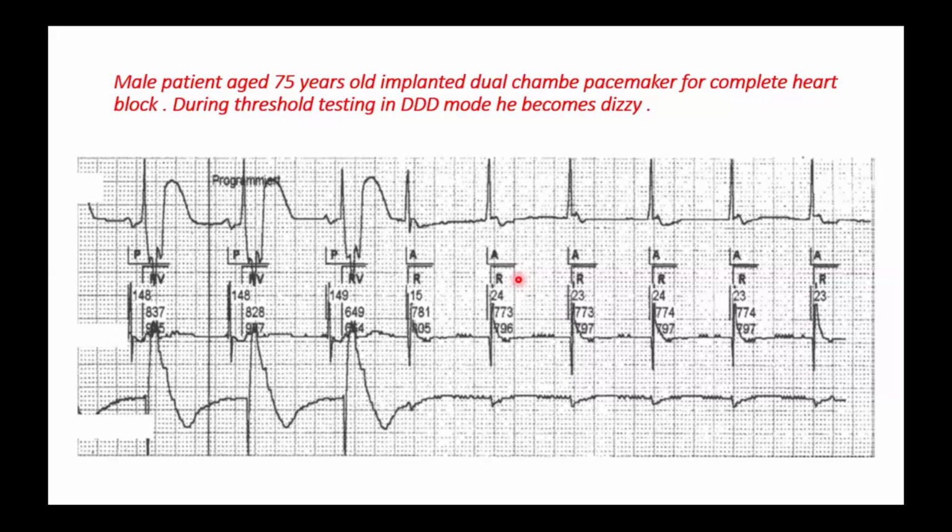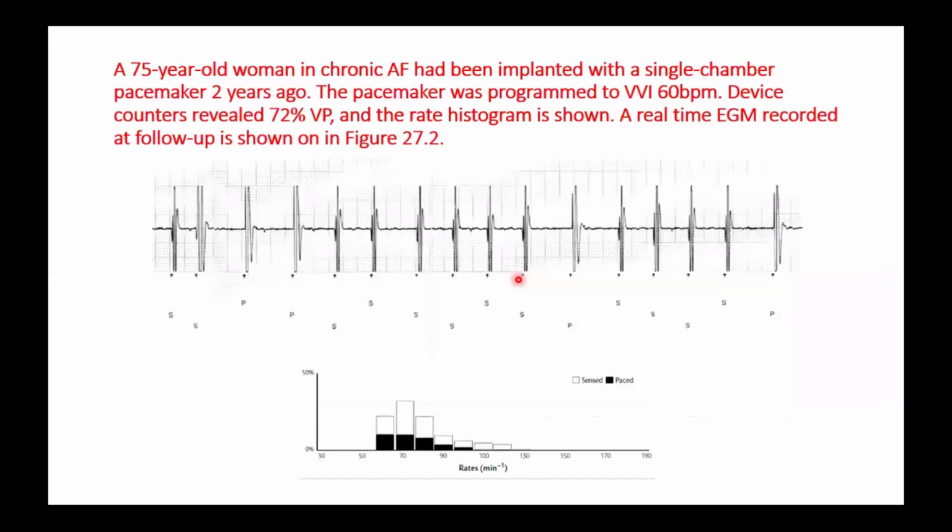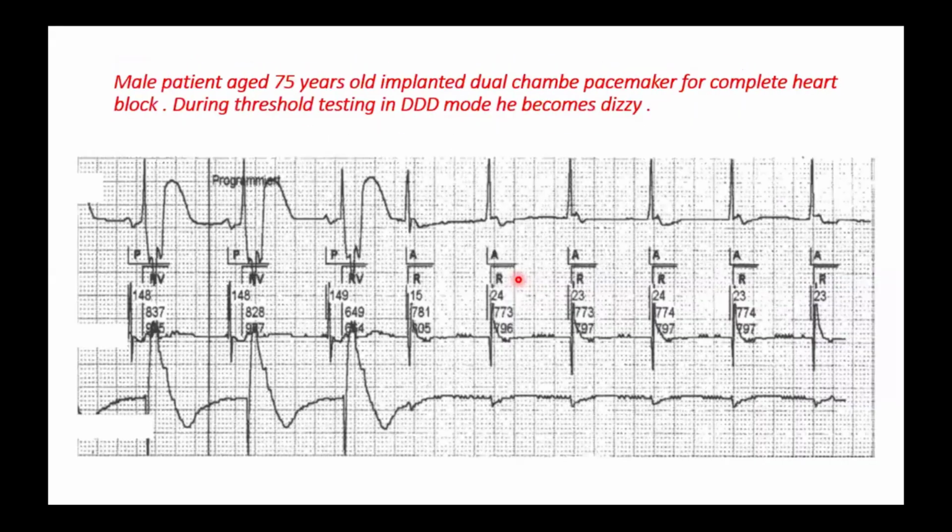So very dangerous. And here is the explanation. This is crosstalk: the ventricular channel sensing the atrial pacing spike, so it reacts as V sensing.